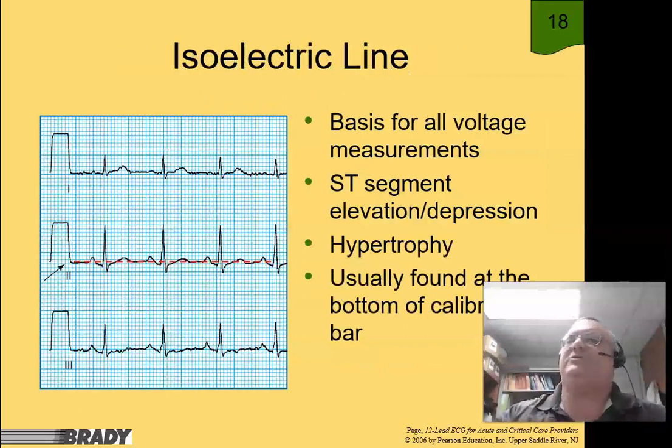Now, the isoelectric line and the calibration. The calibration, I think, is kind of a big one here. All right, so the calibration. Notice that the calibration starts and begins at the isoelectric line, okay?